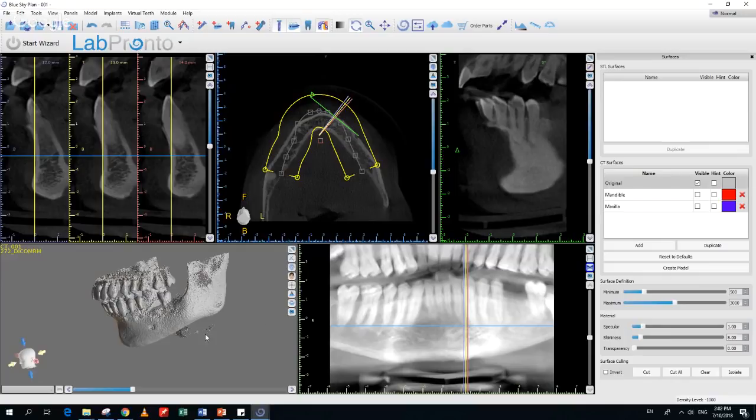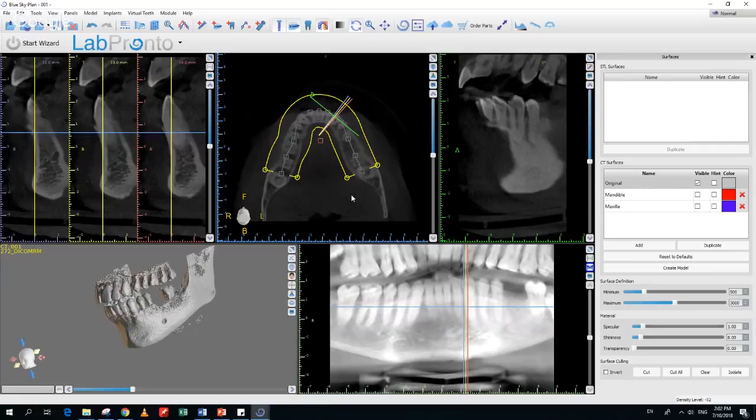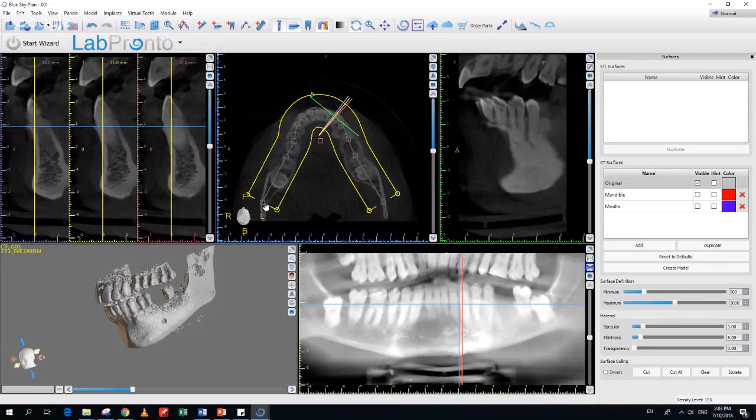Okay, we also have the panoramic curve, which pretty much goes without saying today because the process is automated directly in the software. But if you want to update the panoramic curve, and what that's going to do for you is redraw your pano in the bottom right, you could just grab and drag the curve and reposition it.